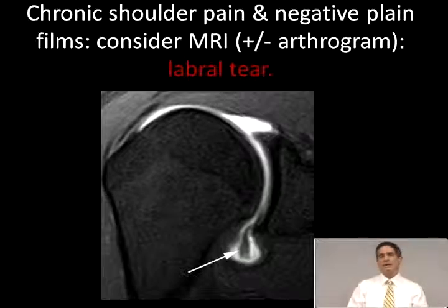Sometimes pinhole tears can escape detection on a standard MR, and so some authors do advocate giving everybody that goes through a shoulder MR intra-articular contrast injection. And opinion on that varies. Now, in this example, we have a 19-year-old who'd had repeated shoulder dislocations in the MR arthrogram. The white stuff in the joint here is the arthrogram contrast material. It shows a large filling defect along the inferior recess from a chronically torn labrum.